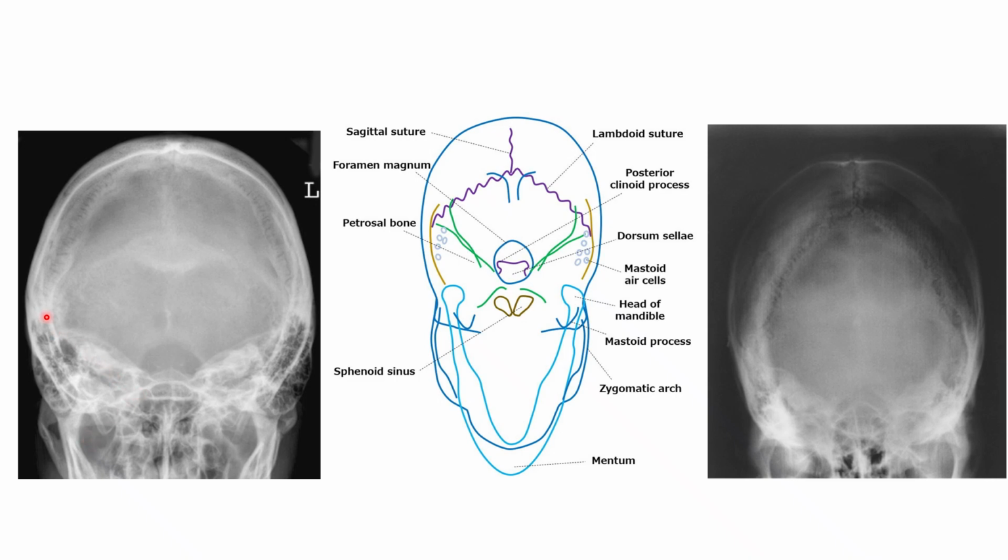So we'll look for the petrous ridges here, out laterally. They'll be elongated and kind of stretched out laterally. All right, that's the petrous portion of the temporal bone. We call it the petrous ridge. The very tip top of that little area there is the petrous ridge. You can see it really clearly right here.